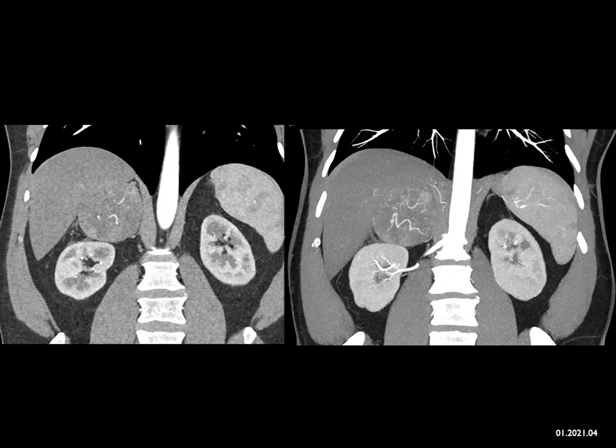I'm thinking, could this be a primary adrenal carcinoma? Potentially, it could be metastatic. That's always a good thought. When you look at the choices, Pheos, it's a good choice. Vascular, though usually more hypervascular. Metastatic lung cancer can be unilateral, can be bilateral, can be small, can be large. Usually it's not so vascular.